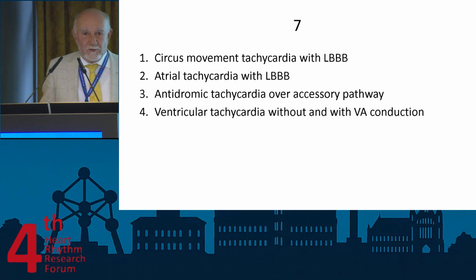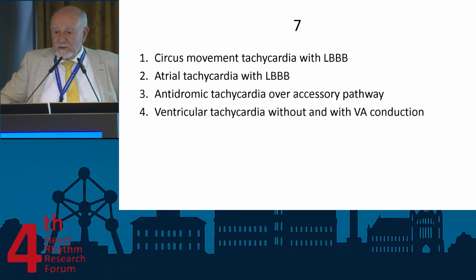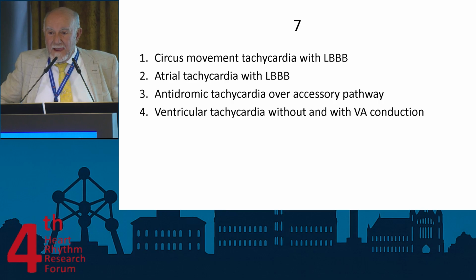Okay, who goes for one? Circus movement tachycardia over an accessory pathway with left bundle branch block? Nobody? Atrial tachycardia with left bundle branch block? Nobody? Antidromic tachycardia over an accessory pathway? There, one.